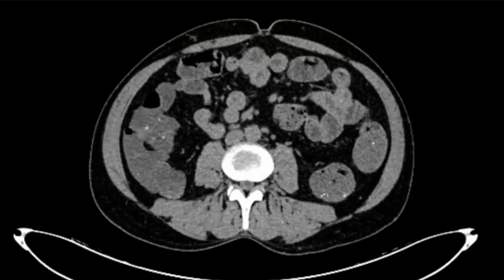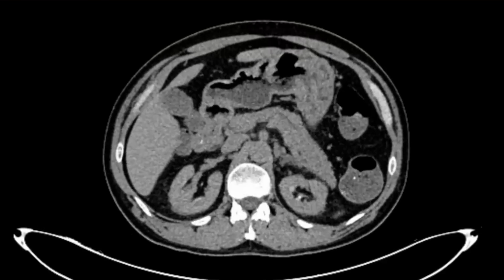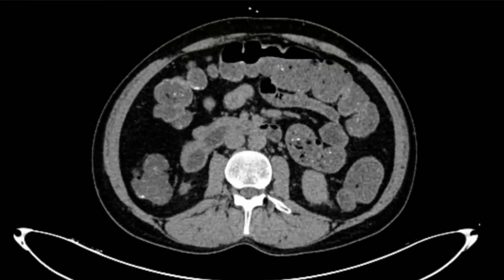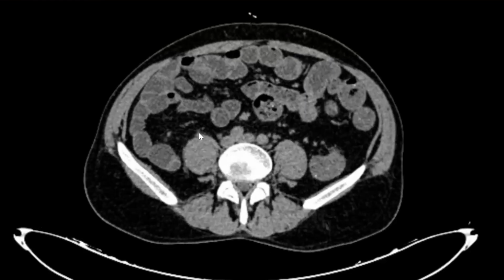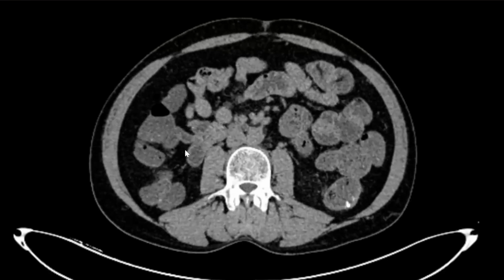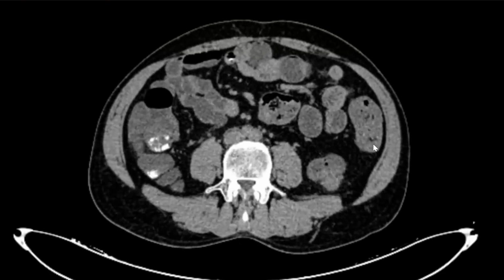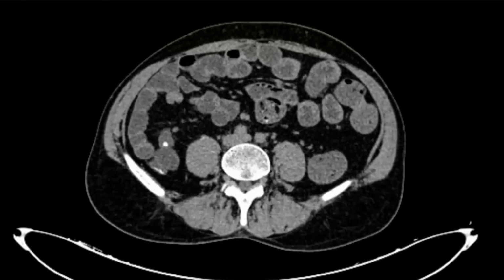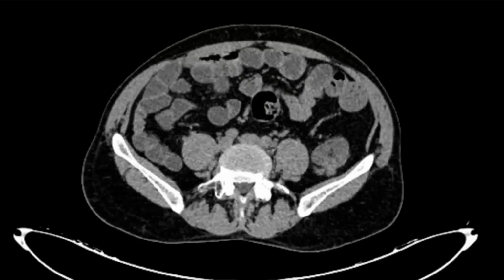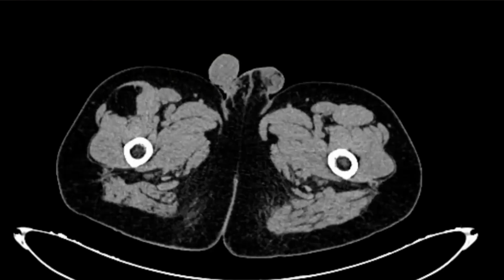The spleen appears normal, and the bowel loops appear largely unremarkable. There are some calcific densities involving some small bowel loops, ileal loops. I would just look at the vessels once. I could not find any gross abnormality in this scan. So I would like to take a look at the post contrast images if available.